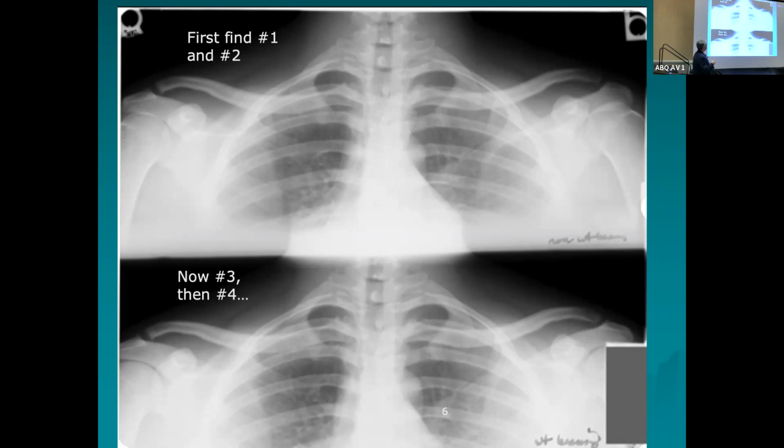I can make out the second one right here, but I can basically just step down. There's 2. And then 3, 4, 5, 6. See how that game's played right there? Okay. Now don't let the clavicle right here obscure your image. Look past it. So find 1 to find 2, 3, 4, 5, 6. Can everybody see those?